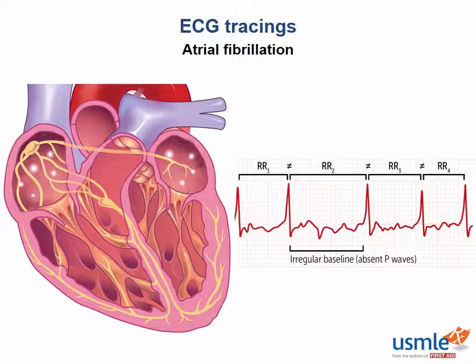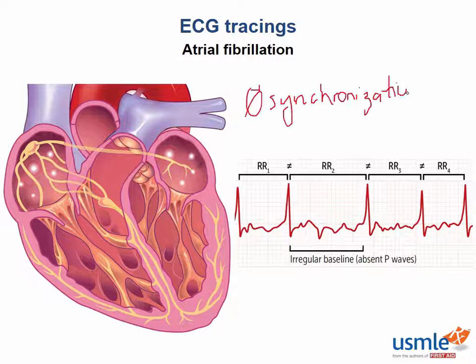So first let's discuss atrial fibrillation. Atrial fibrillation is a syndrome characterized by the atria fibrillating, as the name sounds like. Basically, there is no synchronization of atriomyocyte contraction. The atriomyocytes all behave on their own, contract on their own. There is no synchronized coordinated unit that functions together like a normal heart would do. Now, as a result of this asynchronous atrial contraction, do you think that there will be a discernible P wave on the EKG?